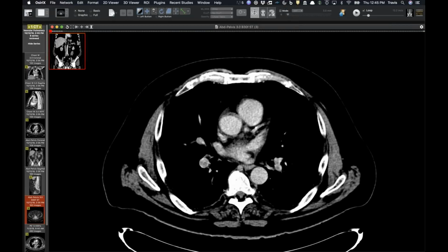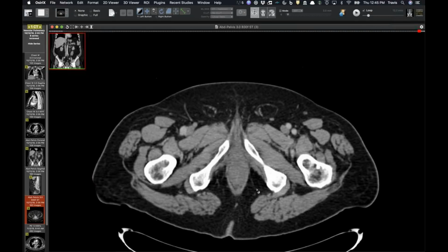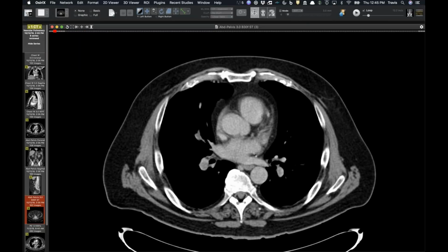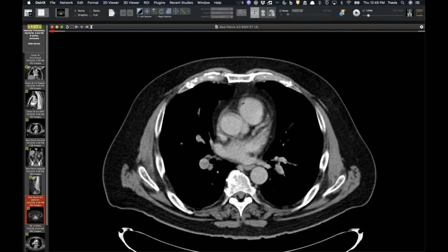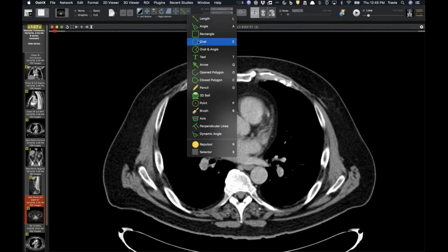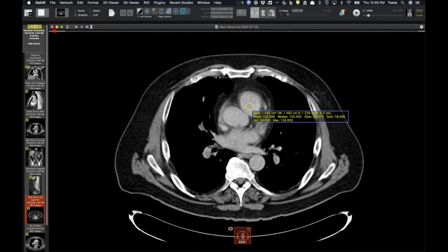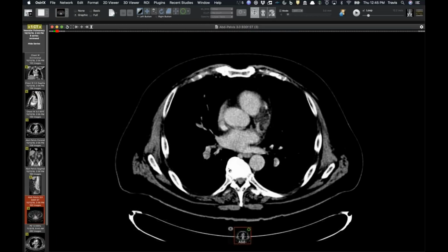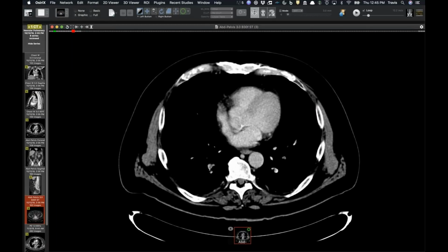And this gets back to the discussion that we've had a few times, and that Seth is the biggest opponent of, and this is the whole idea that there's a minimum threshold for detecting PE of whatever people say, 150, 200, 250 Hounsfield units. Because this one, if you look at this main pulmonary artery, when I was measuring it today, was only 102 or 103 Hounsfield units, as you see here. But these definitely look like acute pulmonary emboli, and especially here.